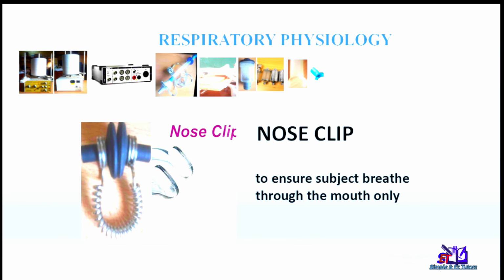Next on the list is the nose clip. This is normally attached to the subject's nostrils to prevent air from coming through the nose, to ensure the subject breathes through the mouth only.